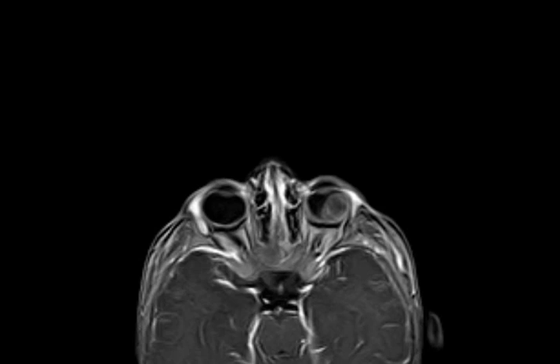Older than this. How much older? Like what? Adult. What would you think the differential diagnosis would be? Melanoma if it's hyperintense on T1. It can be amelanotic, which is much rarer, an amelanotic melanoma. You put metastasis, of course, in the differential, and then you put other lesions like hemangioma and things like that. The others, they are meningeal.